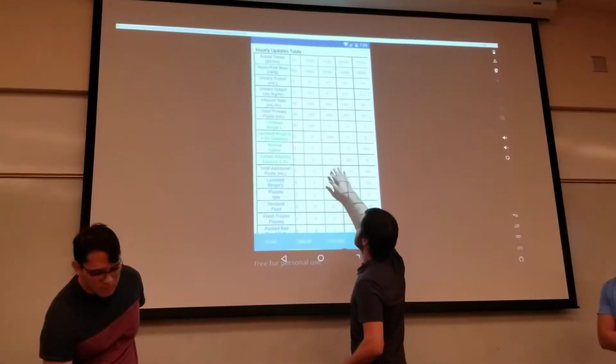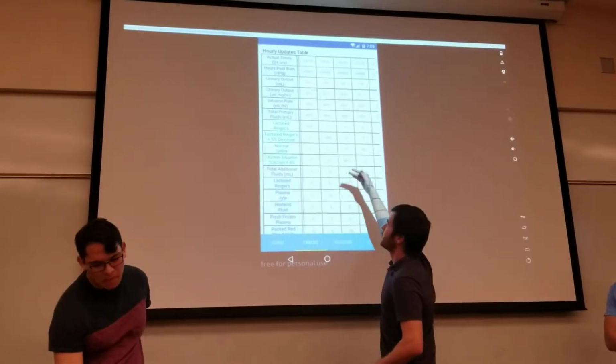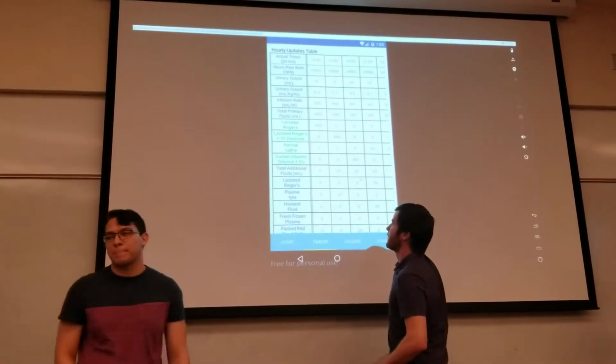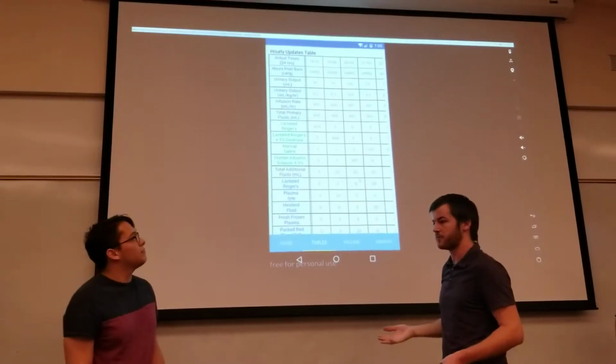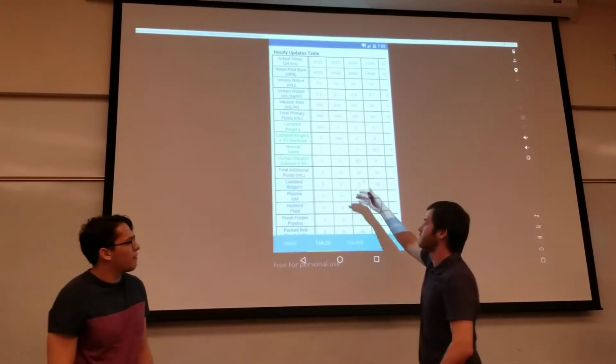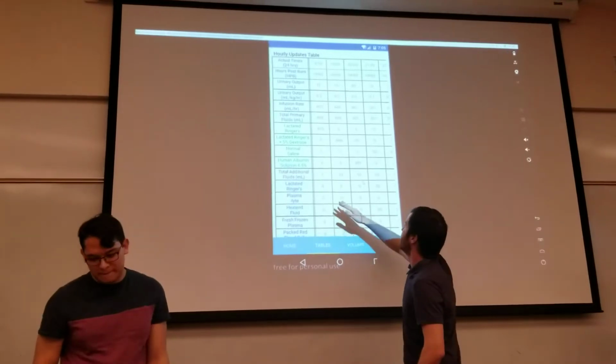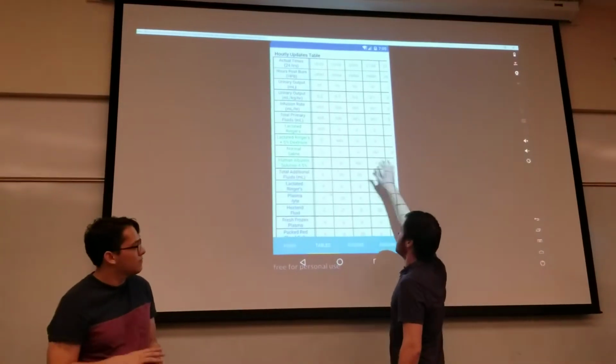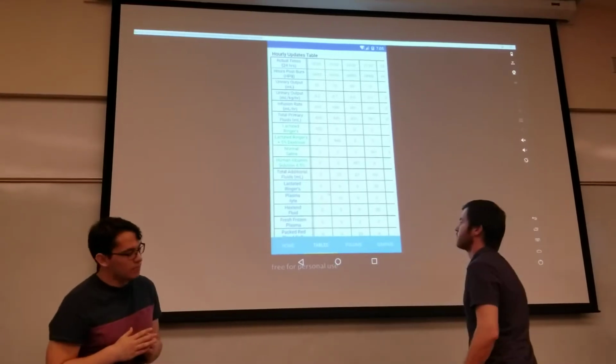And so you can only choose one primary fluid at a time, but as you choose new ones, it'll actually add them to the list here. So right now we've used 4 total throughout the entire treatment. But as you use different ones, it'll start to add them to the list. But if you use the same ones over again, it won't add anymore. It'll just continue to add them throughout these rows here.